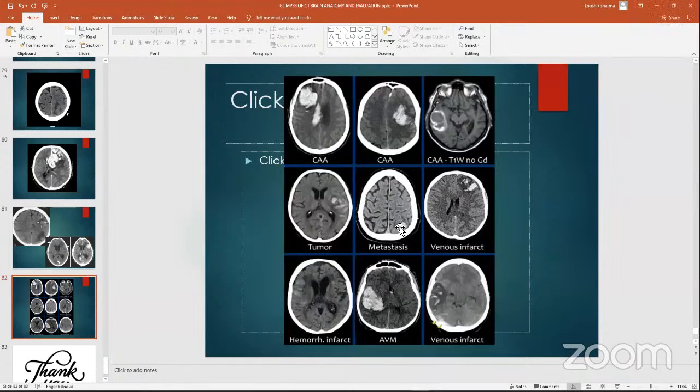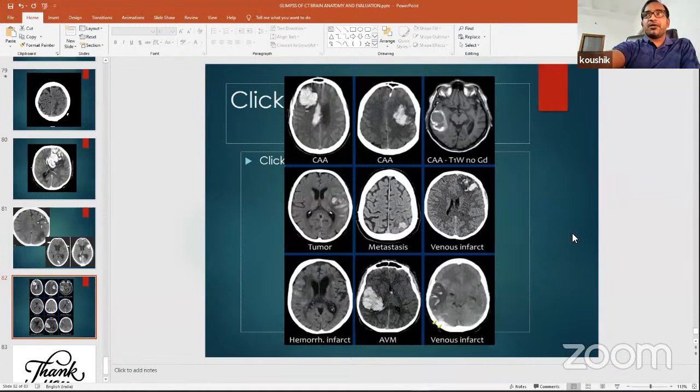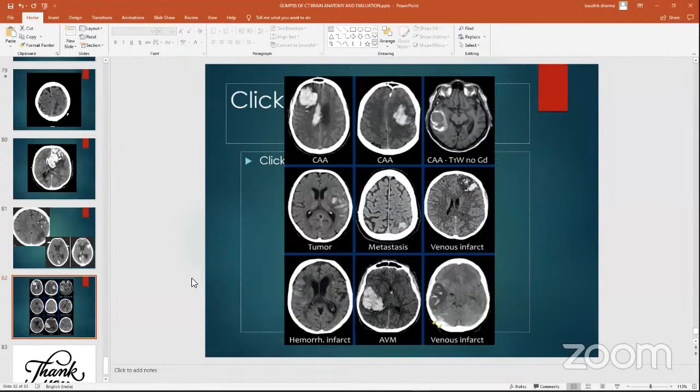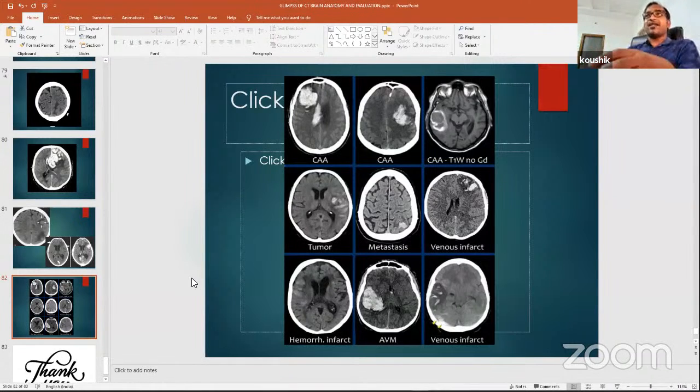The trending question: CT findings of COVID. Okay, you want HRCT findings? CT findings in a COVID patient with neuro manifestation. These are not specific CT findings. In COVID, brain involvement most commonly seen is venous infarcts and venous sinus thrombosis. We had a lot of CSVT cases, where in COVID we are finding superior sagittal sinus thrombosis and transverse sinus thrombosis.